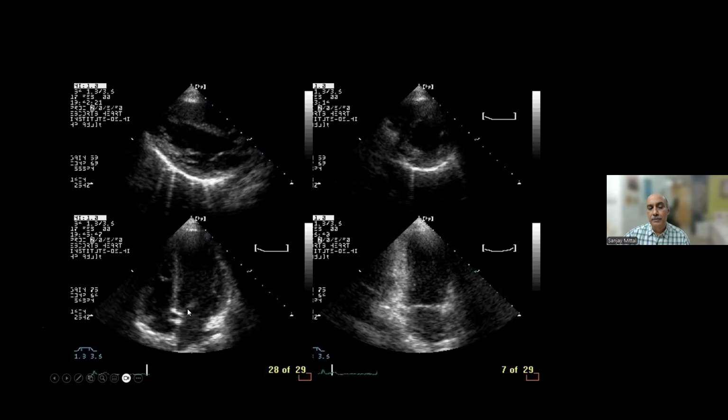This becomes a five-chamber view. Aorta is an anterior structure, and the septum portion adjacent to the aorta becomes anterior septum, not the septum. So this would be a territory supplied by the first septal branch of the LAD rather than the PDA. So this would become a judgmental error. Again, the same kind of mistakes you can make.